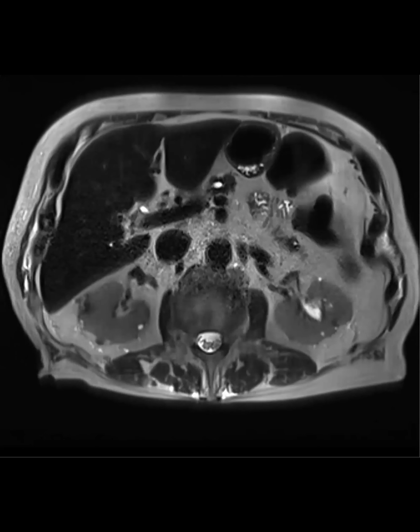Okay, that's all. Teresa, that's a great case. And actually I have a companion case. We recently had one like that, and it was called a potential lymph node or paraganglioma. So I'm also going to call that one up as well. And in CT, sometimes it's a little bit easier to see. It's usually oblong, but I just found my case, so I'll show that one too. On which one did you say it's easier to see? On CT, just a little bit easier to see. Oh, like CT. Yeah.